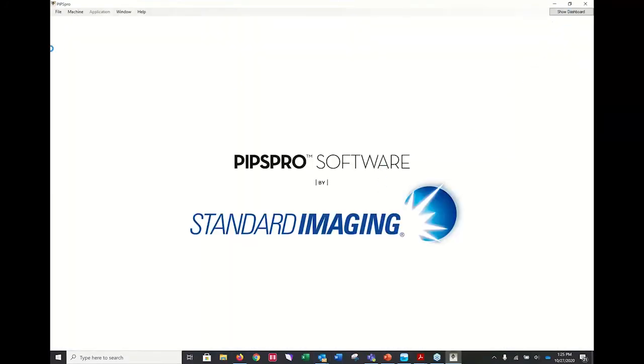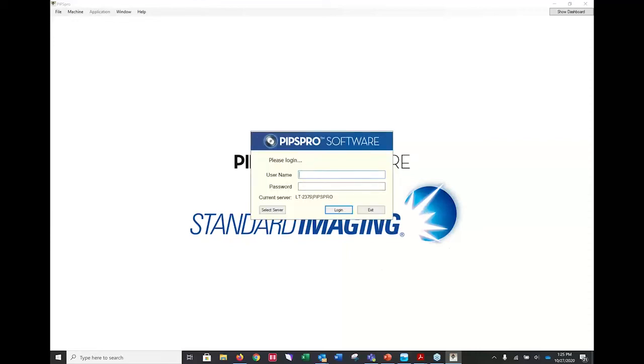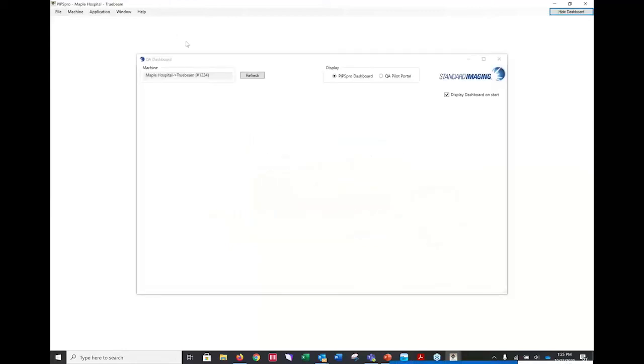This is still beta software of our newest package, so my apologies. Okay. Like I said, things never go perfectly when I do a demo.